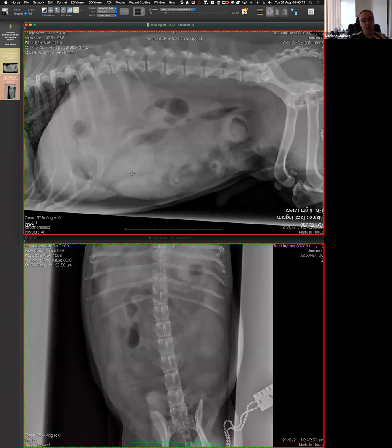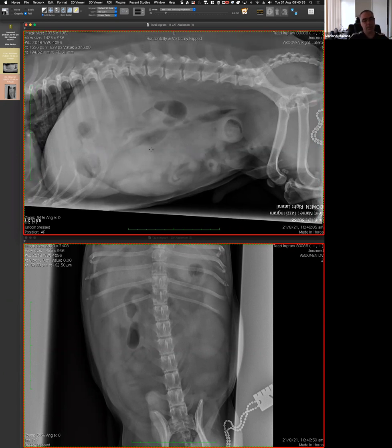And then, the tool that we have, when we have a line like this and we want to stop the tubular structure here, is, can we continue that line outside? Makes sense? And by doing that, we are saying, well, that's not part of that structure. That's something that is superimposed. If you don't like that, you don't like radiographs.